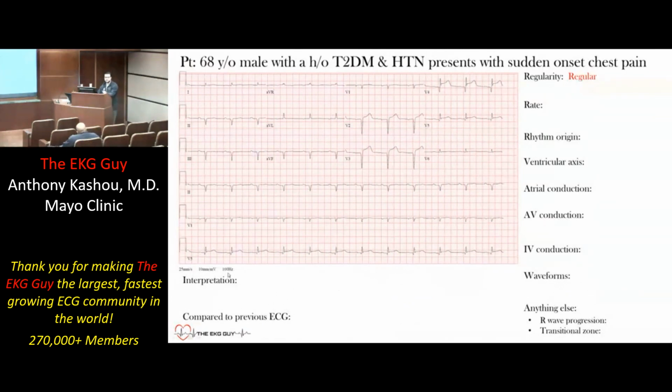So next, we'll look at the rate. Okay? And I know Raimundo is becoming a pro at the rate. Okay? 72? Yeah. Okay, and what do you guys feel the same? Close to that? So let's see. That is very good. And actually, the machine gave us 72.